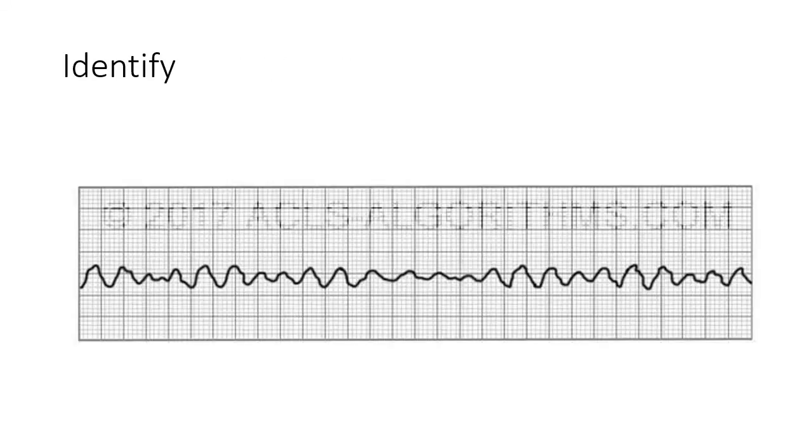Is that atrial flutter? No. Do you see QRSs? No. Oh, is that asystole? Is that what? Asystole? Not asystole. What is this? Anybody? This is VFib. This is VFib. Okay, why is it VFib?